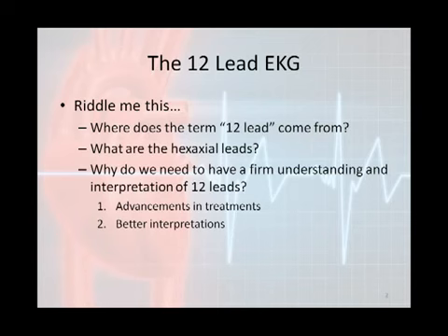Number two, EKG machines can interpret a 12-lead better than healthcare providers. When most people are handed a 12-lead, the first thing they tend to do is look at the interpretation at the top provided by the computer. Many providers of healthcare have become crippled with the advancement of technology and its ability to interpret these results for us. In some situations this may be called for, but at other times we need to look at the results of the test to confirm the interpretation and/or diagnosis.